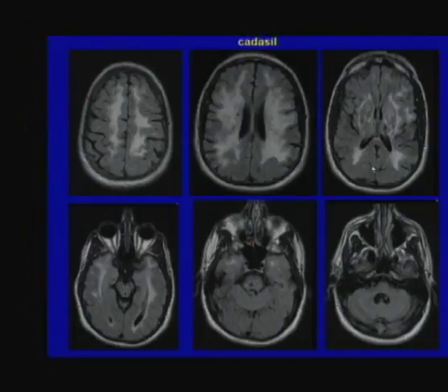Now here's somebody that looks like they have severe hypertensive demyelinating microvascular disease with a bunch of strokes. There are holes in the brain, there are multiple cavities, lacuna-type infarcts. The white matter disease is very severe. There's sparing of the arcuate fibers. The corpus callosum is not involved. The brainstem shows minimal involvement in terms of extent, but severe involvement localized to the pons. There are lacunes in the pons. There are patchy changes. This patient is under the age of 60 and is not hypertensive, not diabetic.